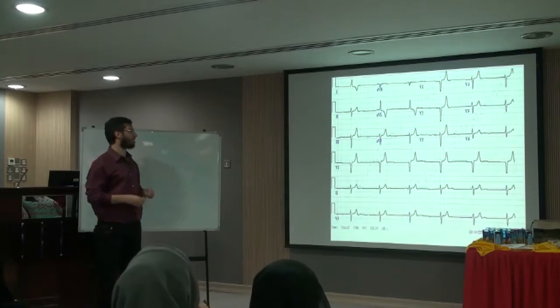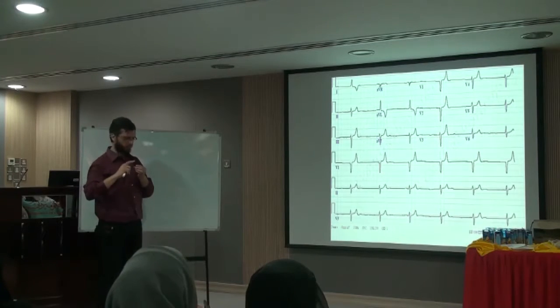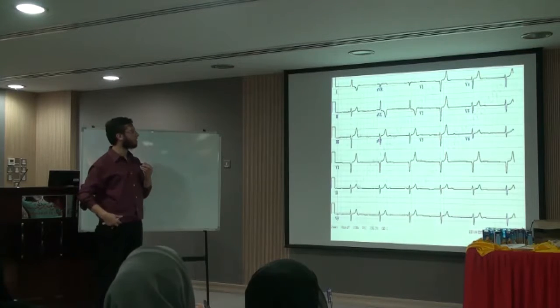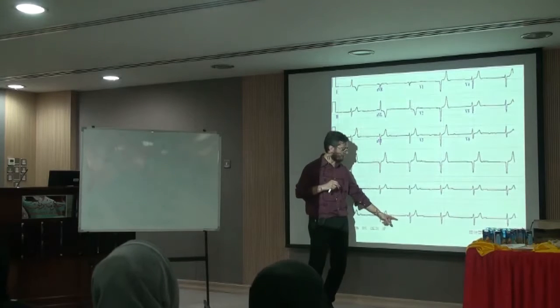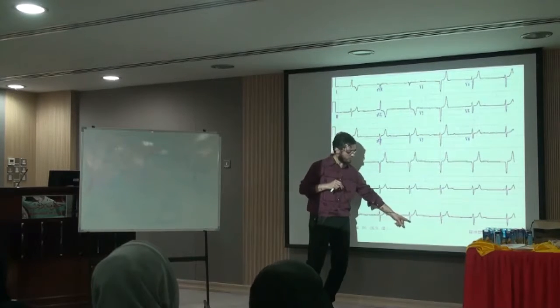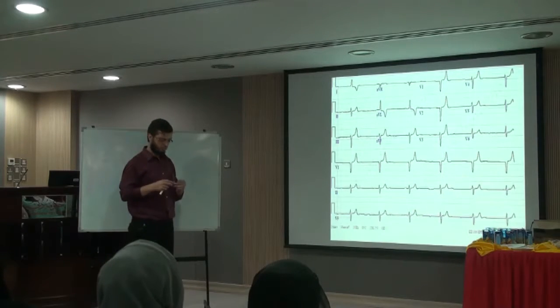Regular. It is regular, excellent. No P. Regular, so how much is the rate? It's about 60? No. 1, 2, 3, 4, 5. Here is 60. 6, 7, 8. So maybe 30. Yeah, 30 or 28. Okay.